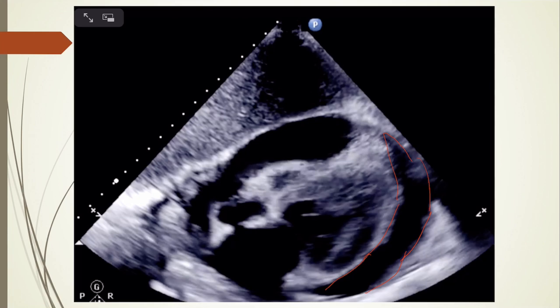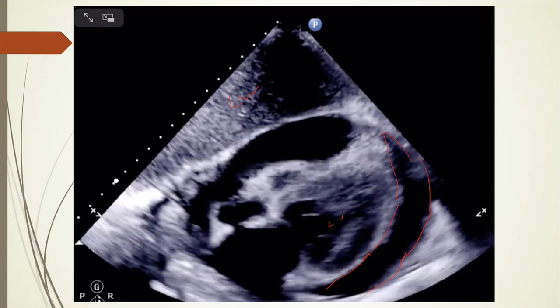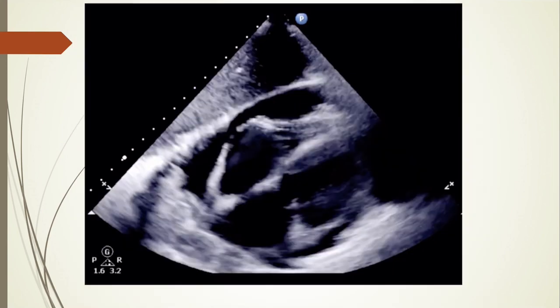I'm not the best picture drawer in the world, but this patient has an effusion. Looks like it's a subxiphoid view, that looks like liver there. So this is going to be LV. And he needs the pericardiocentesis sooner than later, obviously.